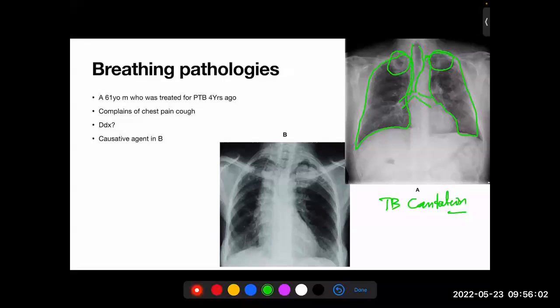Let's go through again. There is this. What's happening there? What's happening to the trachea? So yes, deviation. There is deviation to the right. Okay, good. I agree with that. Okay, then come to the lungs. Come this side. You can see, by and large it looks okay. Here also the angles look okay.